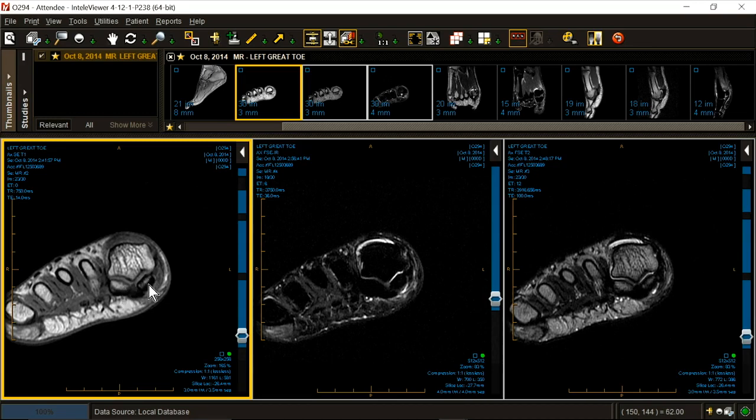Medial side, not so much. Do you all appreciate the asymmetric shape of this compared to that? That's part of the checklist. That's why this sesamoid is sclerotic due to repetitive impaction and altered mechanics of weight bearing.